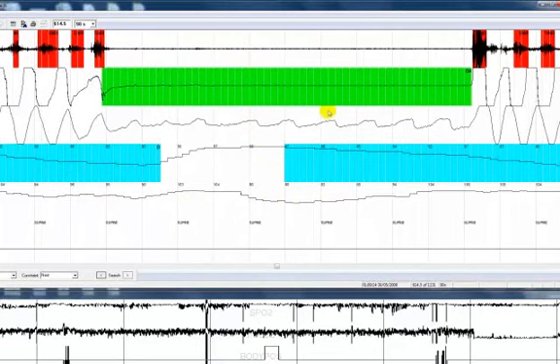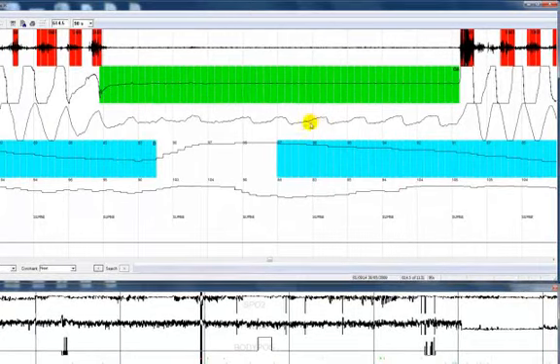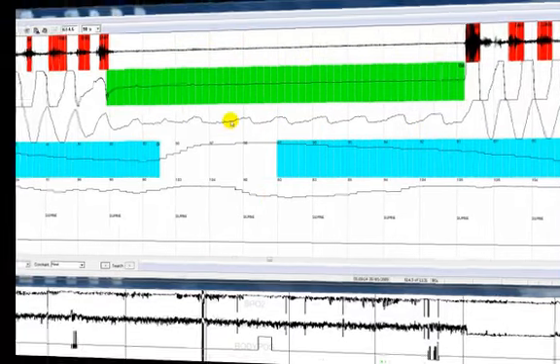So to summarize an obstructive apnea event, we have a cessation of airflow of at least 10 seconds or longer. We have continued ventilatory effort. We have an arterial oxygen desaturation of 3 or 4% or more. We have confirmation of cessation of airflow as indicated as no snoring on the screen. And we also have quite a bit of variability shown in the pulse rate channel. Now let's take a look again at the central apnea event.